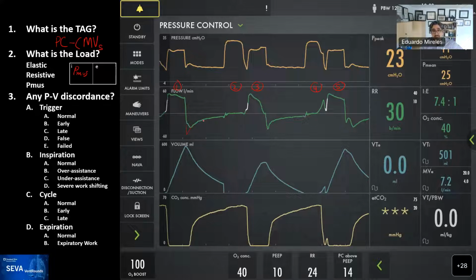This can be expiratory muscle activity, but it's also a feature that may highlight that this patient has very high resistance during inspiration and expiration. And I would probably suspect, from the next waveform that you see here, and we'll talk about that, that there's probably activation of the expiratory muscle.